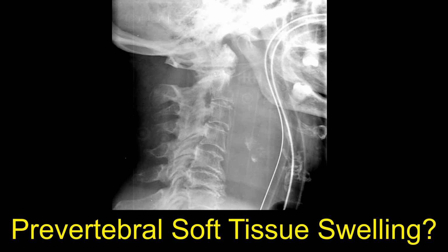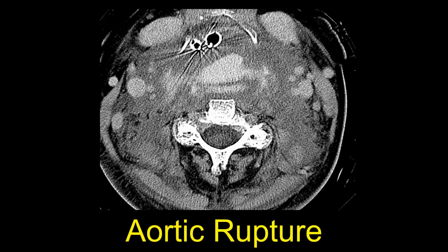Here's another case. Here's a lateral X-ray, and we see the vertebral bodies and the spine. We see a lot of degenerative changes, and the prevertebral soft tissues are way too thick. And we see the nasogastric tube and the endotracheal tube going down, so we know where the airway actually is, and there's just way too much soft tissue in front of the vertebral bodies at that level. And we do a CT. Here's an axial CT image, and we can see the endotracheal tube and the nasogastric tube in the airway pushed way anteriorly. We can see the vertebral bodies, and here we see all this contrast leaking up.